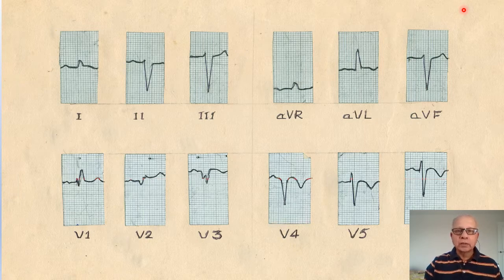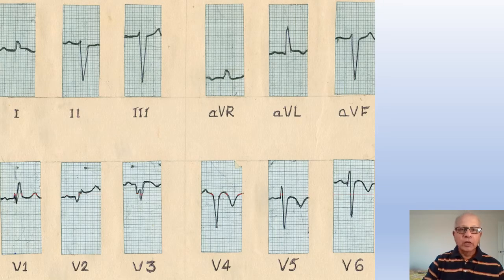So I think simple question, simple ECG, you would have answered it. Now we'll go on to the answers. So let us look at this ECG. There are a lot of findings here.